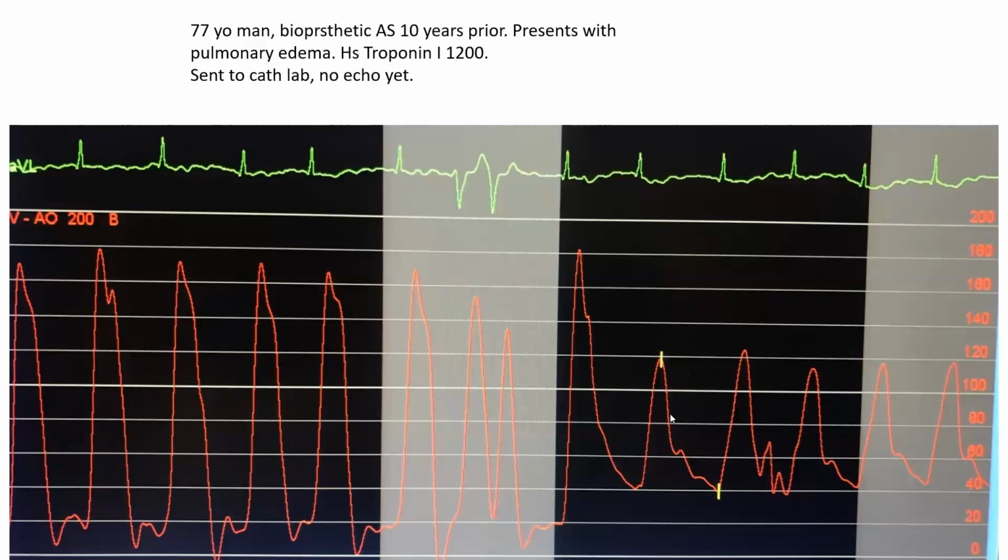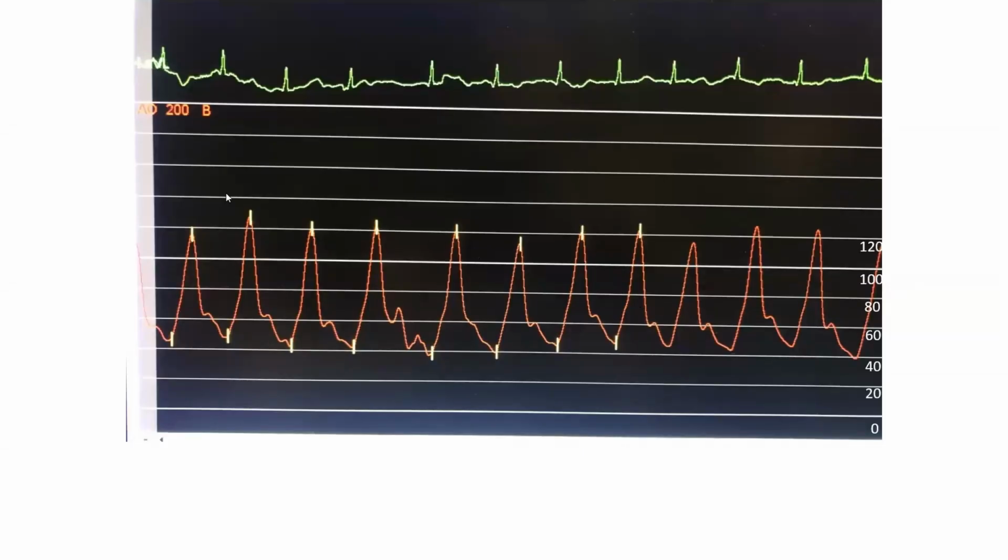Now, what does AI do to AS gradient and AS hemodynamic features? And this is, by the way, the aortic morphology in this patient. It is consistent with some AS features, meaning it has that anacrotic notch and late peaking, although it is very wide for a classic AS.